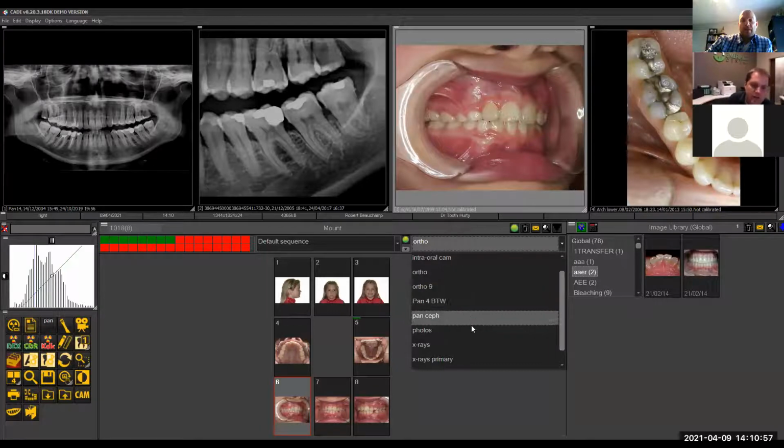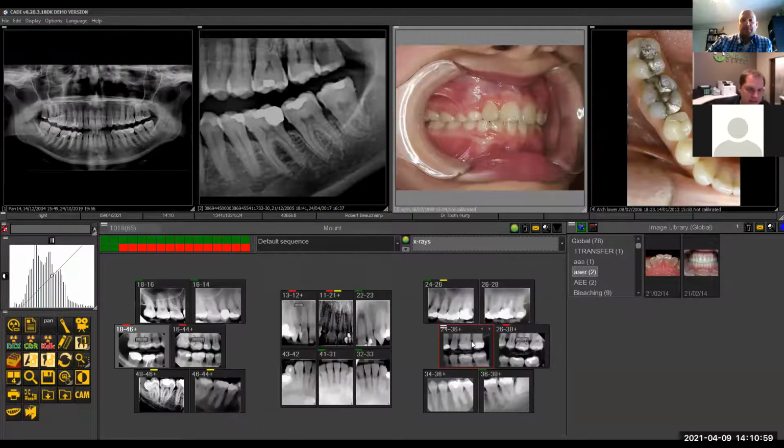And I'm seeing these green and red boxes. I'm assuming that looks like the amount of pictures that are associated with the mount. That's what the green boxes are? Exactly. So a couple of the features up here, I'll just go through. So this is the mount window. At the top is that little activation, move forward or stop on one. That's always visible. It's just a programming element that is part of the acquisition.